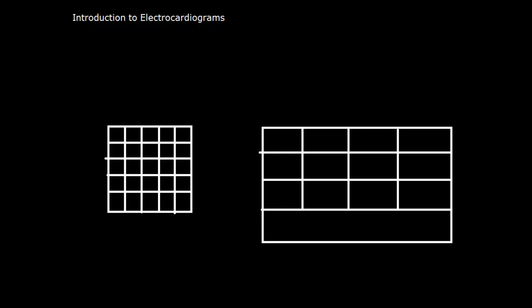So just an overview of the overview. ECGs are really non-invasive and fast tests. They can provide a lot of information about cardiac function. Some of the things they can tell you about are the rate and regularity of heartbeats, how big the chambers are, and probably most clinically important, if the heart has any signs of damage. It's not a 100% accurate test. It can't tell you everything, but it can definitely give you a lot of clues and point you in the good direction. So it's good to know about them when you're on the floors.